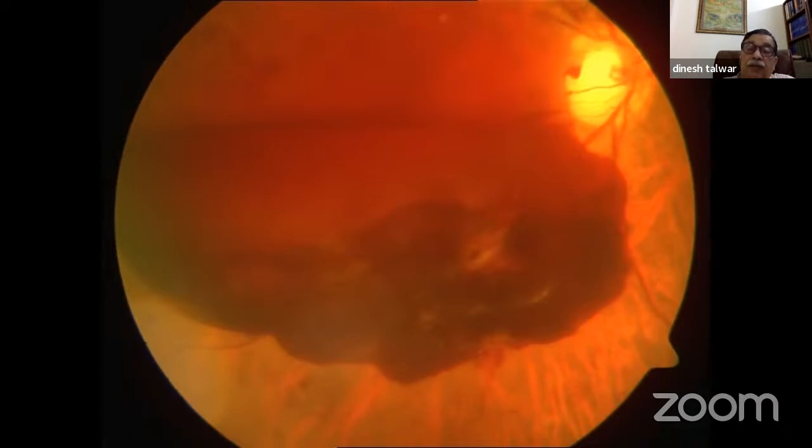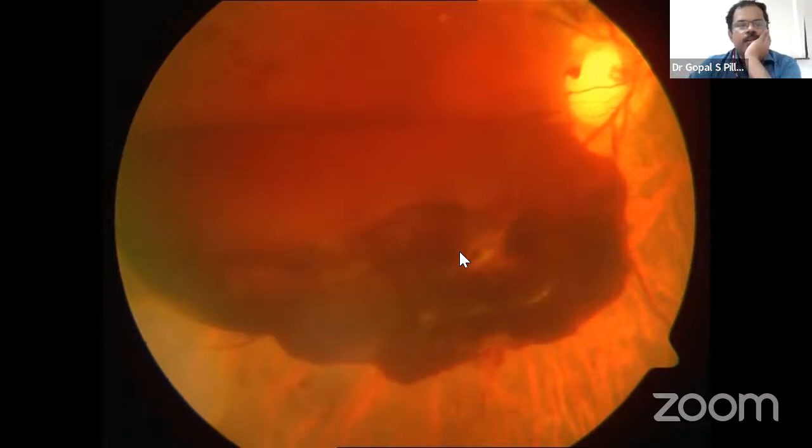Right? Yes, sir. Now let me show you actually in this hemorrhage only, there is one area here. Look at this. Because this was a very, very shallow, very thin layer of pre-retinal blood, over here the blood vessel is hazily seen. Can you see that? I don't know whether you can see that. Sir, are you talking about this area, sir? No. Just half a disc diameter below the disc.